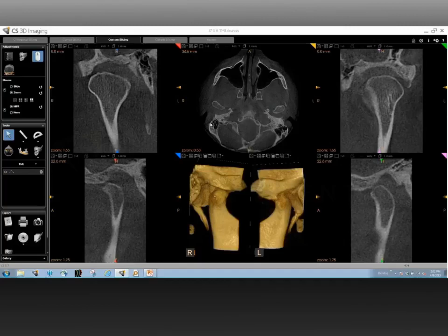Well, this is getting much more interesting. Okay, so let us start with the scan. So I think, Jordan, what you just showed was how to reconstruct the multiplanar views in a TMJ image, and it looks great. So let me start off with a couple of things just to reemphasize on what Jordan said.